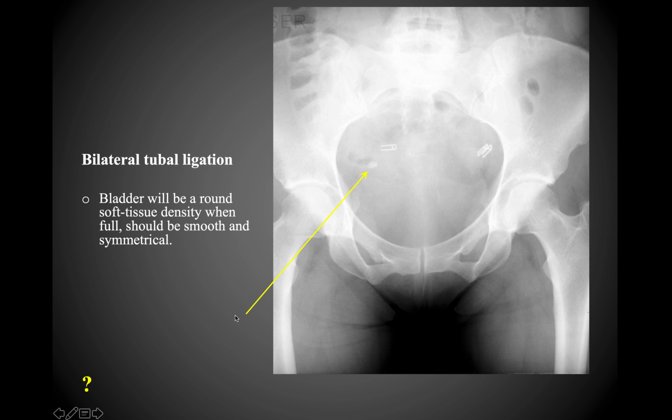We'll be looking at the uterus and some of the other reproductive organs in the pelvis and how these appear on radiographs of the pelvis. And then we'll also move into some additional pathologies that will hopefully help reinforce the normal anatomy of the pelvis.